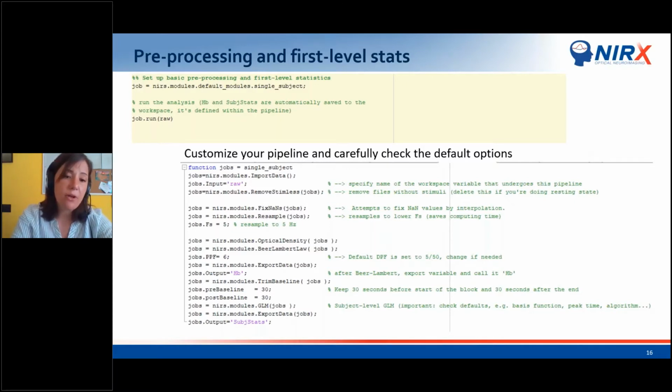Normally, by default, it's set to 0.1 because it includes also the partial path length factor, which is totally valid, but you need to know that you are using the partial path length factor, also because it's something that you may not necessarily want to do, and then also because then you wouldn't know maybe where the order of magnitude comes from.